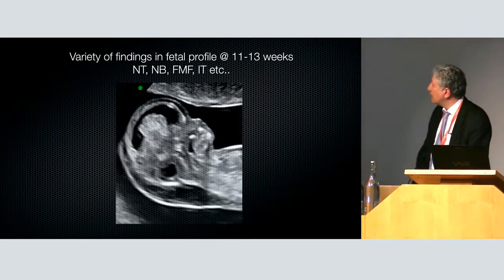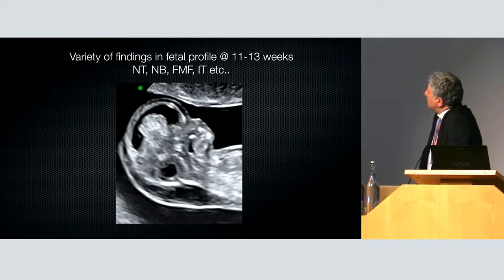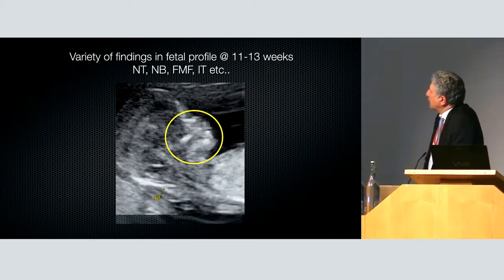So this is why, if you look now at the images, you remember this fetus we saw this morning, you see the gap is here, and if you take this one, the anterior part is missing. You never have a nasal bone without the processus maxillaris, and here there is no part of the maxilla. But if you didn't look at this region, you will never see it. You will tell me that this NT is not very well done.